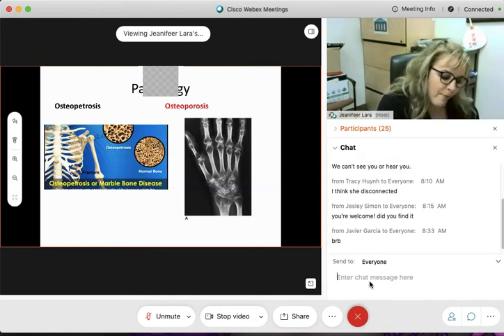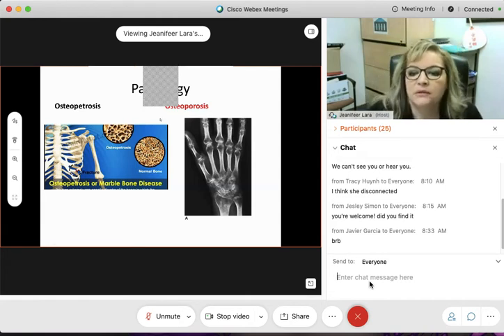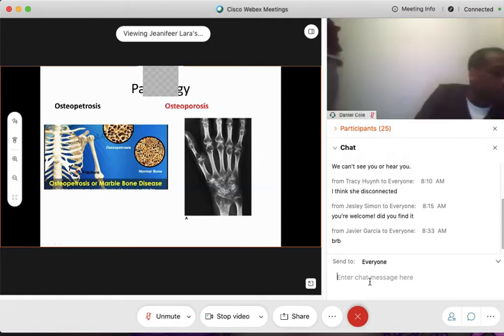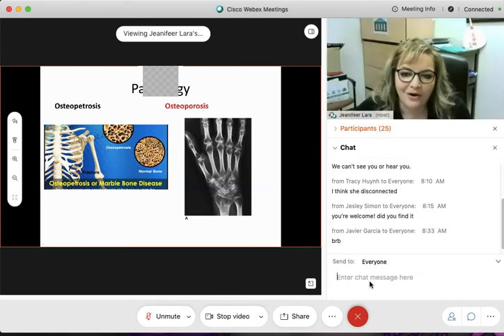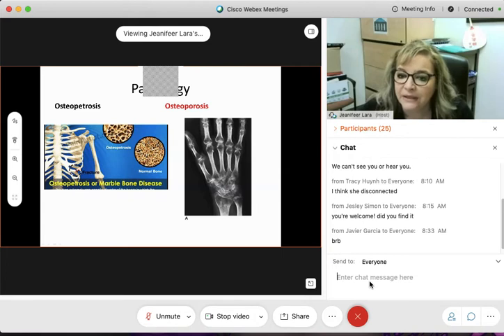Radio-opaque. Are you sure? Darker areas? Brighter areas? Not darker, brighter areas. Darker, radiolucent areas. Radiolucent means that x-rays are transmitting. We're going to bring in a little bit of PRE. X-rays are transmitting more effectively here in these areas than here in the bodies of the metacarpals. Make sense?